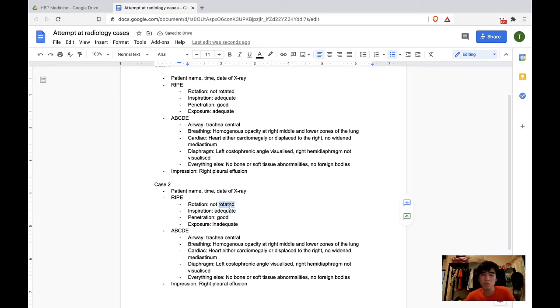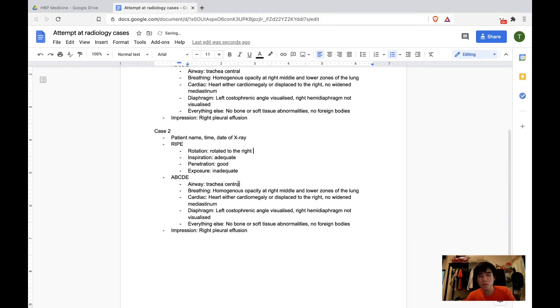Inspiration, adequate. Rotation. Airway, trachea. Breathing.